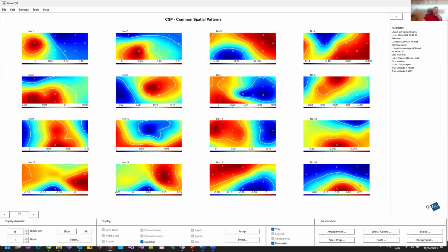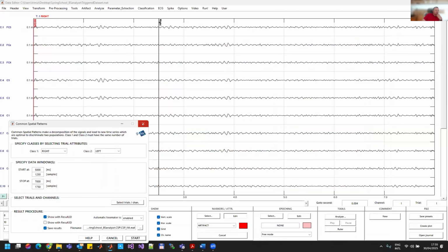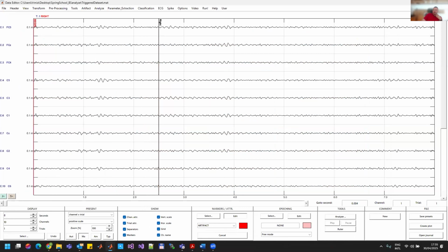Yeah, it's almost in the same way, but it looks to me that it's very good. Except we don't see exactly the spot moving around here. It's not a problem for now. As I said, I would have to make a very close investigation or run some other software, some other functions, for this. I won't do it now because the time is not allowing us. So I will go on with the spatial filters.